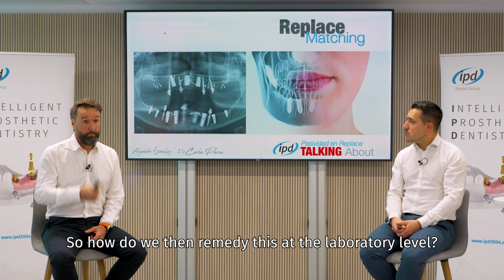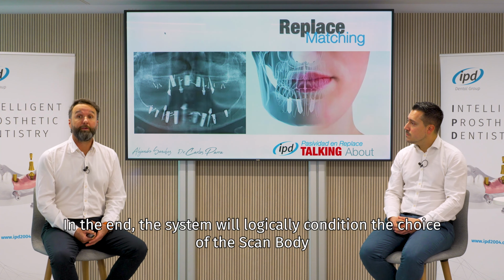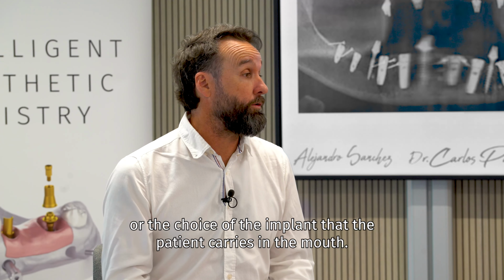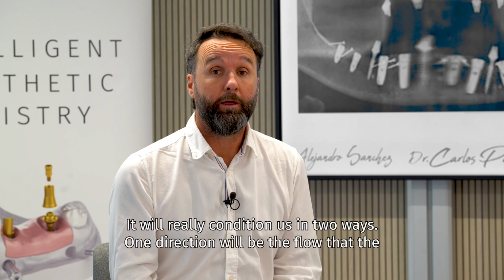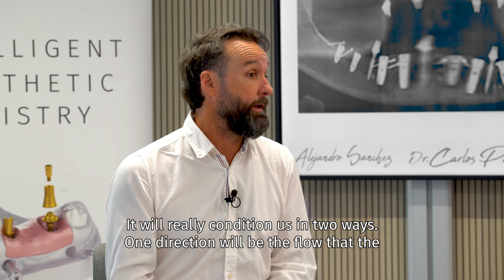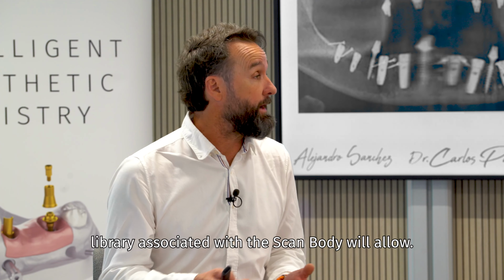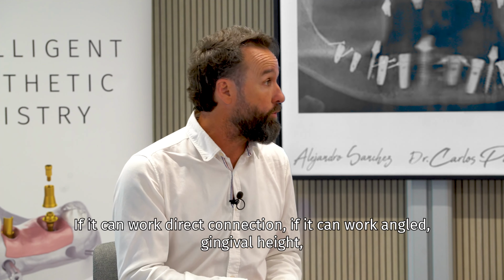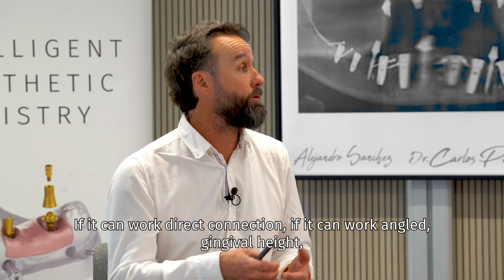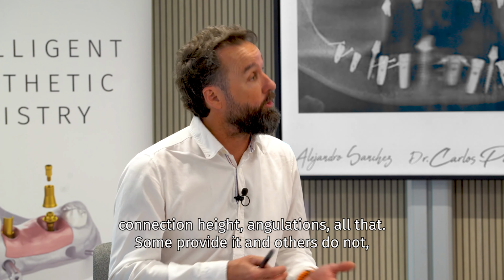So how do we then remedy this at the laboratory level? In the end, the system will logically condition the choice of the scan body or the choice of the implant that the patient carries in the mouth. It will really condition us in two ways. One direction will be the flow that the library associated with the scan body will allow. If it can work direct connection, if it can work angled, gingival height, connection height, angulations, all that. Some provide it and others do not.